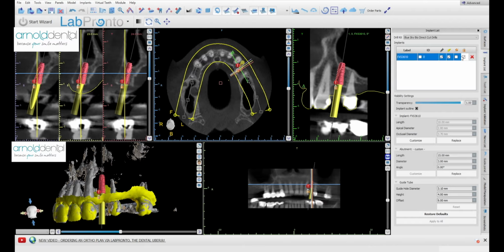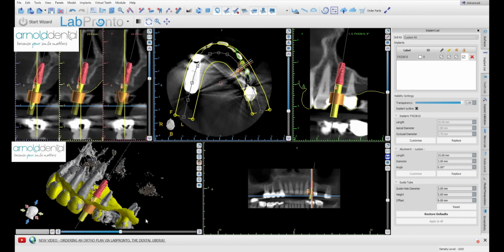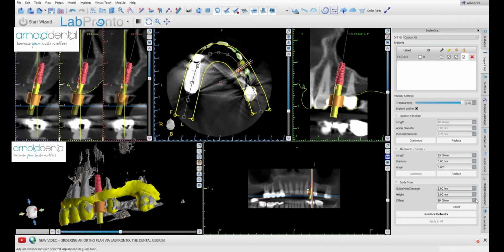So once I'm happy with that, I've removed the tooth, because the next thing is I've placed a tube guide, that gold coloured ring that's going to fit around, and that's going to create our drill guide, or the opening of the drill guide. So I'm just adjusting the lengths so that it is compatible with the tube sleeve that we use and the printer settings in our 3D printer. It all kind of relates, and that's stuff that we figured out over time.